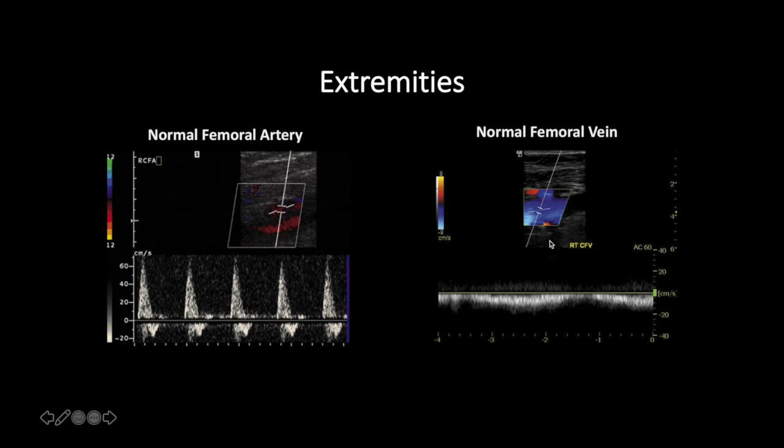And so we don't have too much time to talk about deep venous thrombosis or DVT detection. That's kind of a basic ultrasound skill. That's not the purpose of this topic. But let's talk about specifically looking at using Doppler in extremity arteries in specific clinical situations.